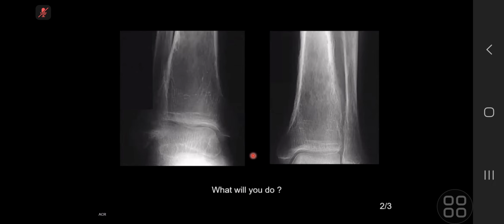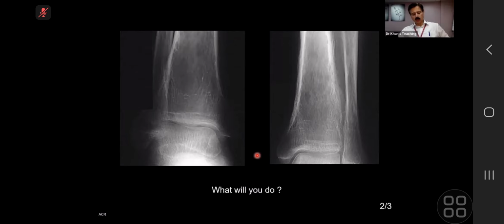in an adult patient, my differential diagnosis would include hypertrophic osteoarthropathy. I would consider pachydermoperiostosis, but that would be clinical as well, and thyroid acropathy, but that less commonly involves the long bones and is more pronounced in the hands. Okay, other differential, sorry, I'm cutting you because of the time factor. Well done. What will you do next?